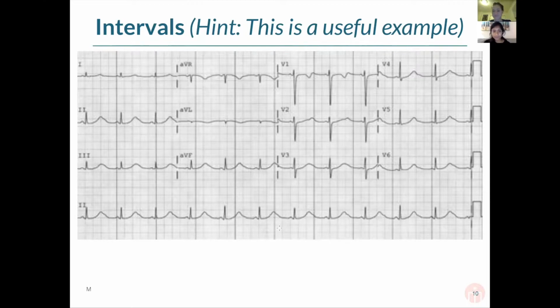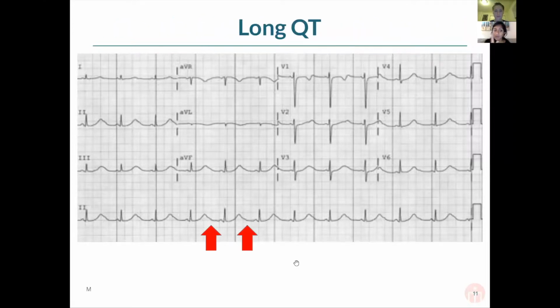But yeah, absolutely. If we look at the next slide, we can see that exact halfway trick. You see that the T waves have not quite yet finished. So this is an example of a long QT because they aren't quite done yet. Really hold to the T wave having to be totally done. We have to be on the flat line now, really using that as your threshold.